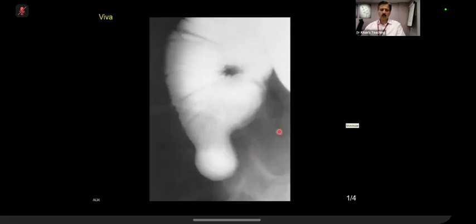Number 2? Okay, I thought that I'll finish, but I've still got a few films. We'll crack on. Motivation is the key in exam, and I know it's 9:15, but we will finish whatever is left. Spot diagnosis, what is it?